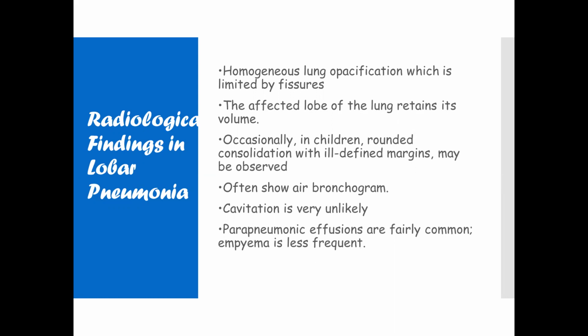Then it often shows air bronchograms. Cavitation is very unlikely, however, it may be present. Pneumonic effusions are fairly common and empyema not so frequently.